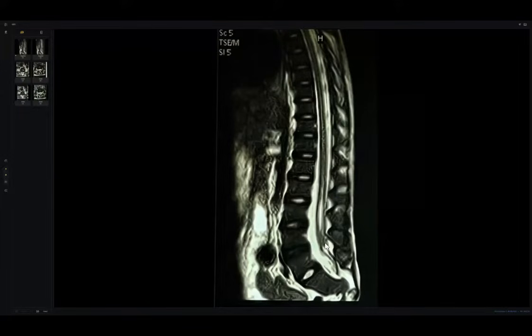This is tethered cord. Doctor, what is the meaning of tethered cord? I think in a case like this, the examiner must ask you this. What do you mean by tethered cord? When the cord is extending below the normal level and is tethered to the lower, like the sacrum or the bone. What is the normal level in this age group? Usually it is L2, L3 level in this age group, but on this one it is extending up to almost the S1 level.